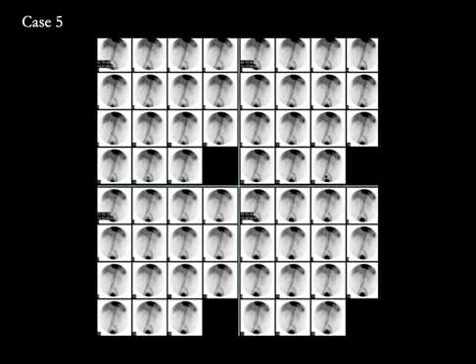This is an interesting one. As we go through the images, we find that there's a focus of abnormal activity that appears right here above the urinary bladder, and then it goes away. And then as we go further, we find that it appears again right here, and then over a period of time it goes away. And then the fourth set of images is negative.